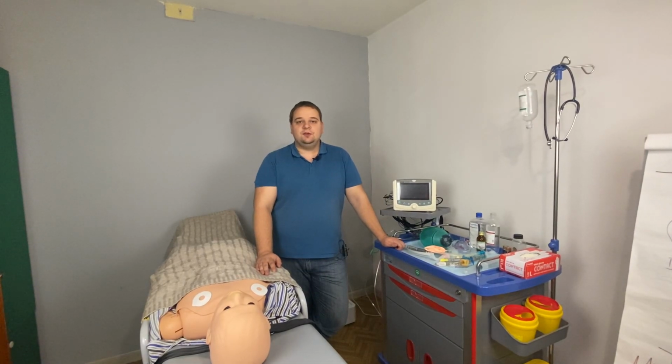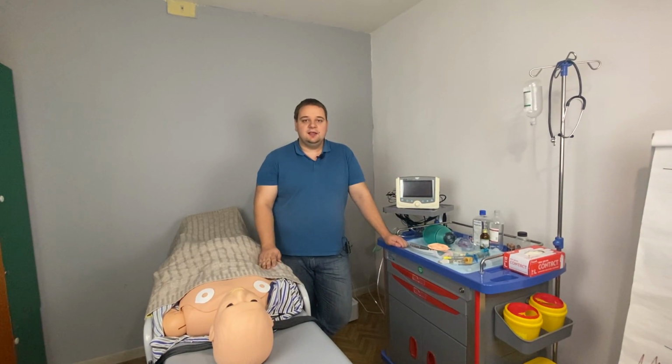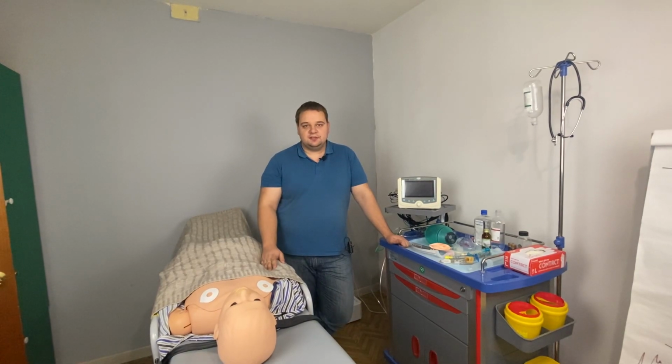Okay, that's it for now. Now you know almost everything about airway management, but remember to practice daily. Only in this case you will be a professional in these maneuvers.